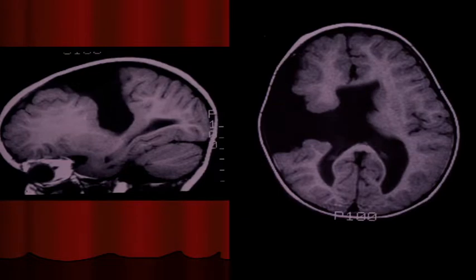This is one of your neuronal migration disorders. The big ones that we know are, what is this one? Schizencephaly, and to be exact, what would you call it? Open lip. Open lip means that look at this huge space here. Closed lip, this edge would be abutting that edge. This defect is lined by abnormal gray matter. There's abnormal gray matter right in here, and it'll always go from the outer part all the way to the ventricle. So this is schizencephaly, like a hatchet.